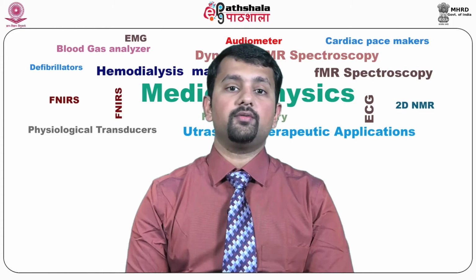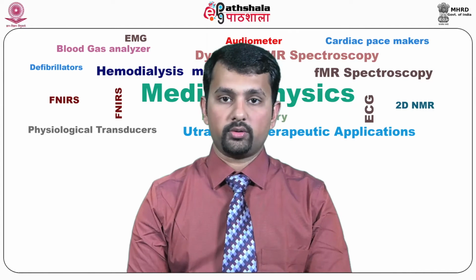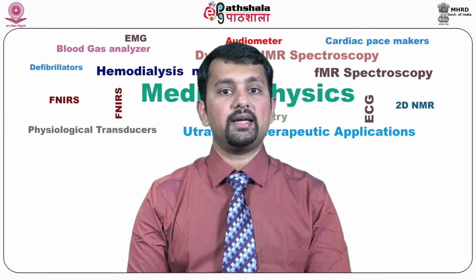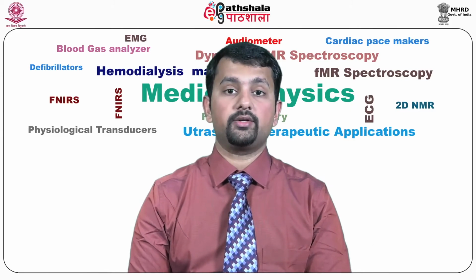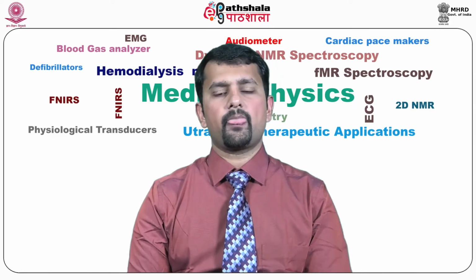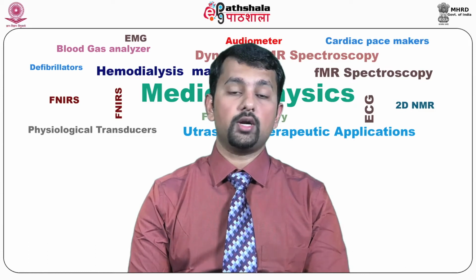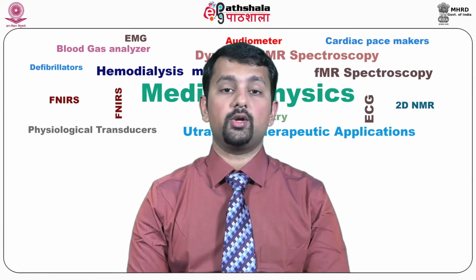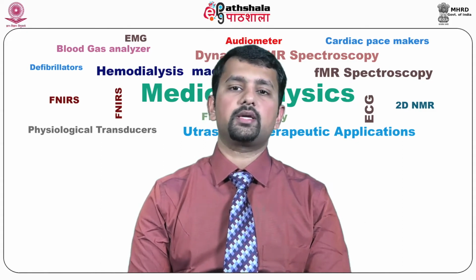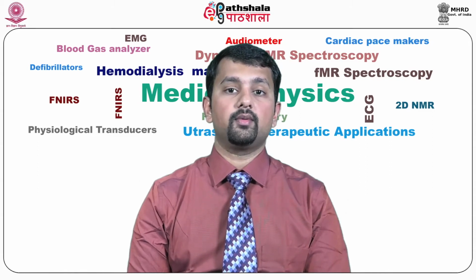Other metabolites observed in brain neoplasms include taurine in primitive neuroectodermal tumors, alanine in meningiomas, and glycine in high-grade pediatric tumors. If biopsy is required for diagnosis, the choline NAA ratio can help us differentiate areas of solid tumors with the highest cellular density from edema. Multivoxel maps can further help localizing the site for biopsy from infiltrative brain lesions.